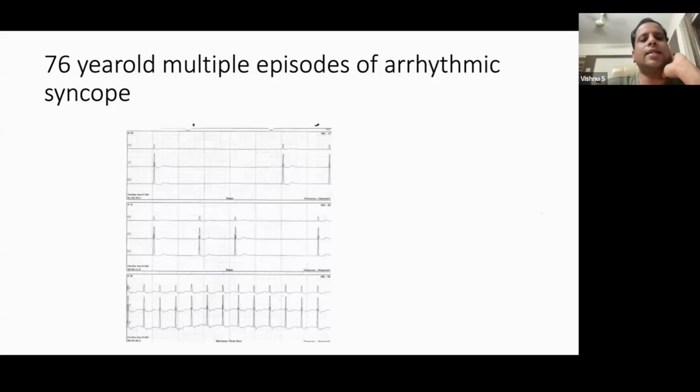Yes, it's correct. This is a sinus arrest. Sinus arrest means either the sinus node is not firing, or whatever the sinus node fires, due to exit block, third degree exit block, is not conducted to the AV node. So this is typical of a sinus arrest, with a prolonged pause. In between there is no systole, so no ventricular contraction happens. Blood flow to the cerebral circulation comes down, and the patient will have a brief episode of syncope.